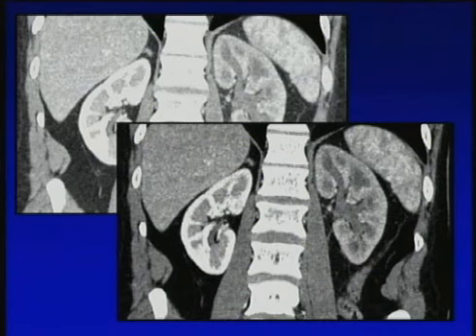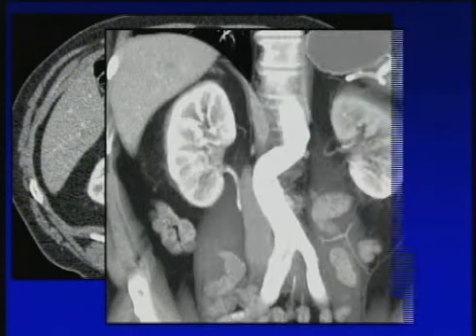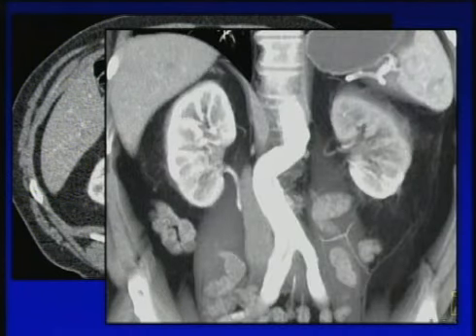And also from a global perspective, you're able to look at perfusion because in this case, the difference in perfusion is the entire left kidney. In other situations, it'll be portions of the kidney. Another example, again, dissection, again, the difference between the enhancement of the right and left kidney. And you see that a bit better on a 3D volume acquisition. And when you start looking a bit closer at this case, you recognize that the difference in perfusion is in a sense in both kidneys.